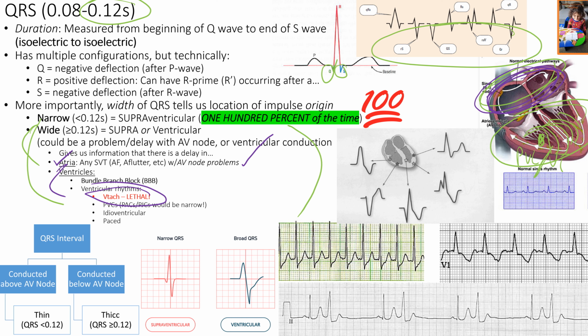Yes. How do you interpret the rhythm at the bottom right? Bottom right, it's a bigeminy. It's a PAC bigeminy. Actually, it looks a little bit like a PVC, but it's a rhythm that's ectopic. It's happening before it should, right? It's happening out of nowhere.